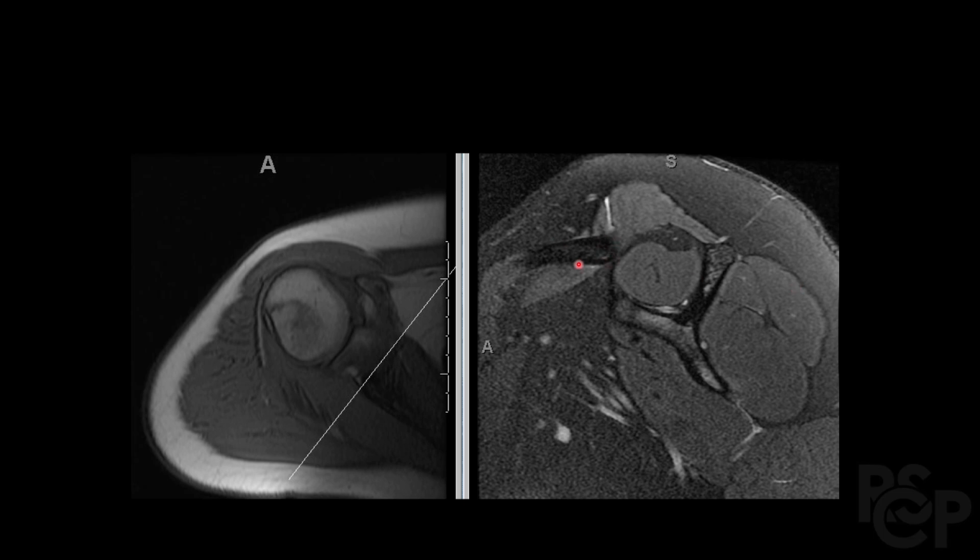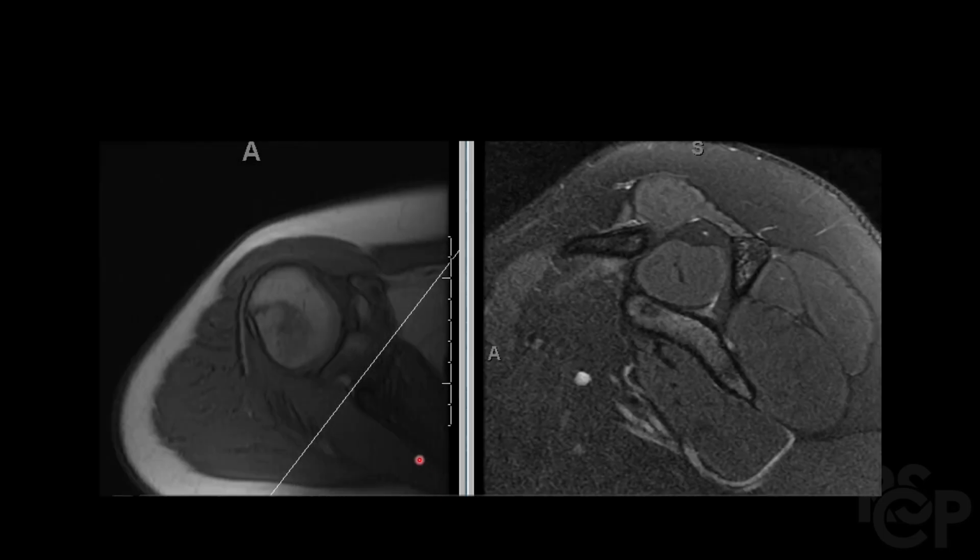So this would be the clavicle up here. This would be the scapula, the coracoid process, and then the acromion. Okay, and now we're moving a little bit more laterally. So again, that's the anterior side and then the posterior side. So the muscle that's on the anterior aspect is the subscapularis, just right over here. And again, this is the coracoid process, the supraspinatus up here. This will be the infraspinatus, and then the teres minor kind of down here. This is the clavicle, and this is the acromion.